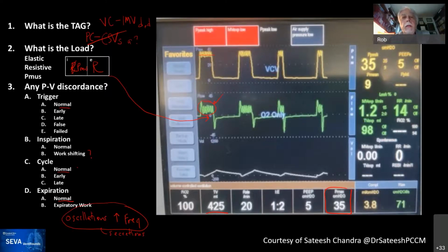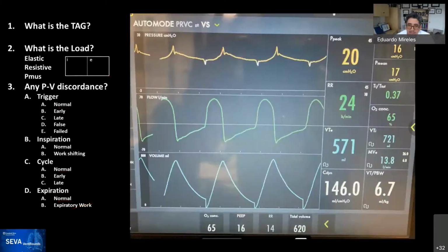Yeah, so there's something drastically wrong with this ventilator. It's not operating according to the manual. Well, if anything, this should point out that this is totally abnormal, and we probably would be suggesting, I mean, we rarely change ventilators on patients just because of something, but this doesn't look normal, Satish. So thank you for submitting that. All righty. Woo! Tough one.